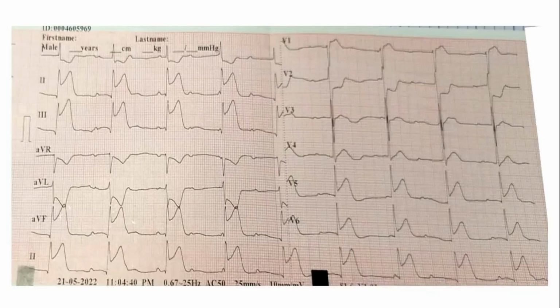Yes, sir. This is the ECG showing ST elevation in 2, 3, AVF, and there's the V1 ST elevation and reciprocal changes in lead 1 and AVL, and V2 ST depression. So this is the acute inferior wall MI, most probably with the RV infarction, and along with 2 to 1 heart block. Okay, great. So we'll not comment on the AV block. For that, we might have to look up a few other things, but good, this is very right.